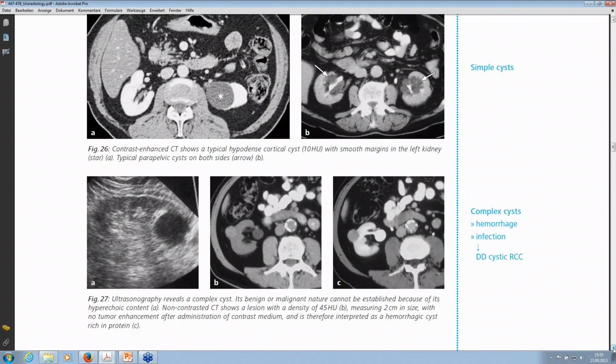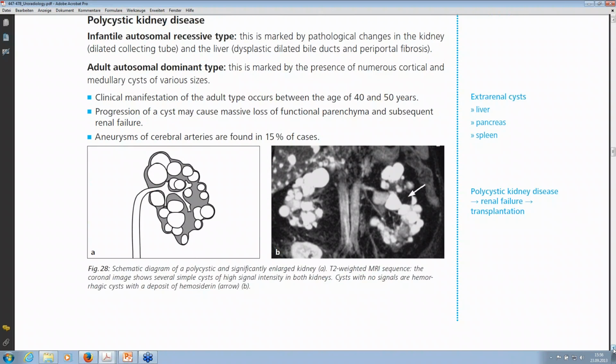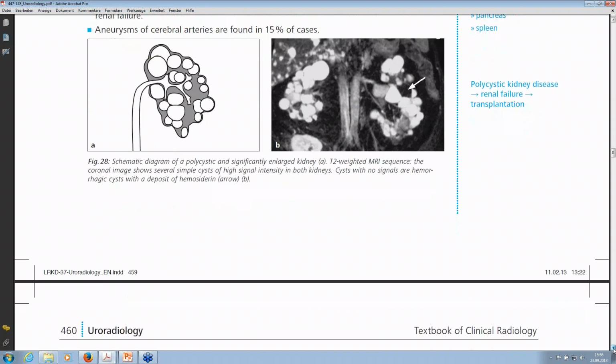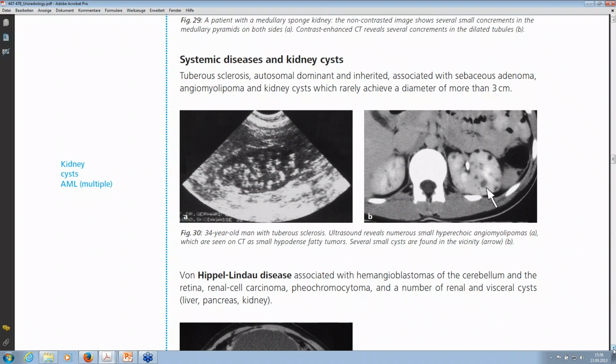Very common and very important are renal cysts. You will find them very often, and they are like liver cysts, completely anechoic round masses in the kidney, and they can be cortical or in the pelvocalyceal area, and then you have to take care not to mix them up with hydronephrosis. And in some kinds of disease you might meet polycystic kidneys, but we don't have time to concentrate on this. Here we meet again our angiomyolipomas.